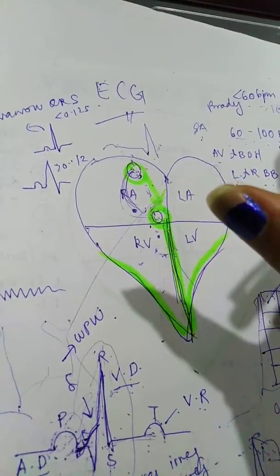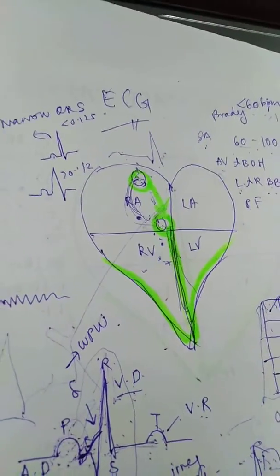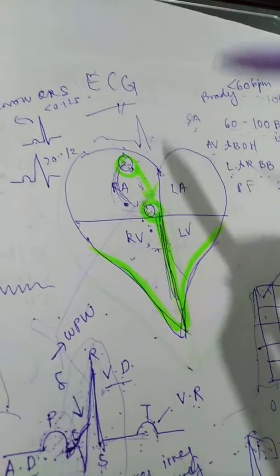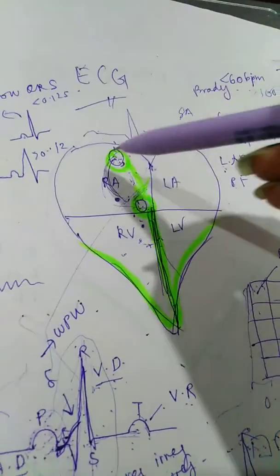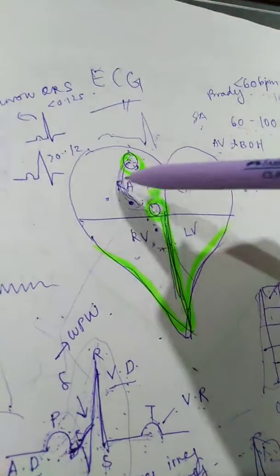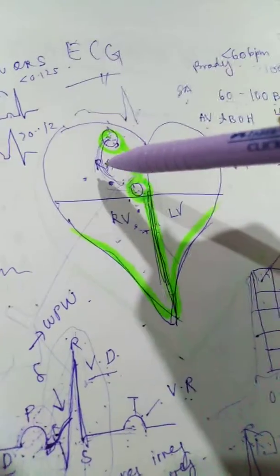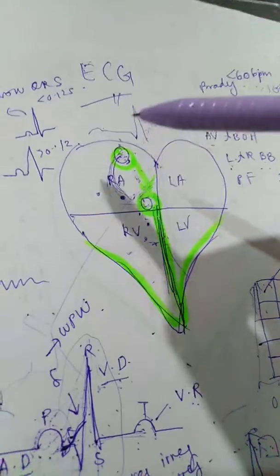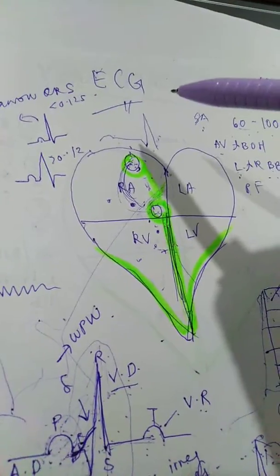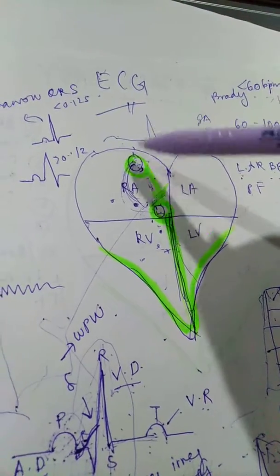If they are broad, you've got a P and then you see a broad QRS complex like this, which means they are more than 0.12 seconds. A broad QRS complex occurs if there is an abnormal depolarization sequence. For example, probably you have a ventricular ectopic where the impulse spreads slowly across the myocardium from the focus in the ventricle.